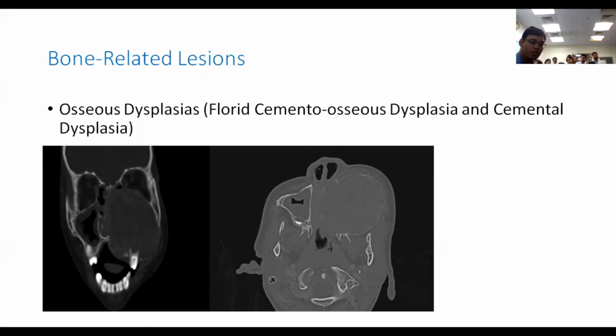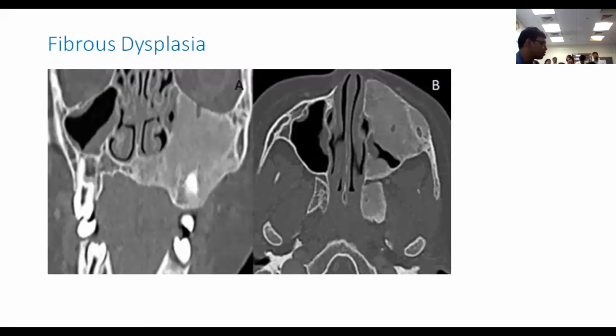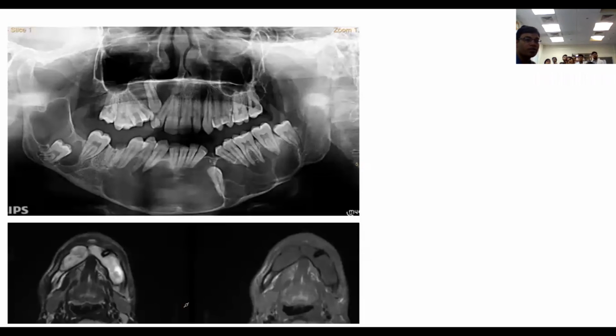There isn't a fibrous kind of association; it is more osseous. Sometimes we cannot differentiate further, so you can note fibrous dysplasia that is ground-glass. Subsequently, on histopathology, there are many markers that can further differentiate. If it is not growing, and that is the most common location, most of the time it is fibrous dysplasia. What is this?